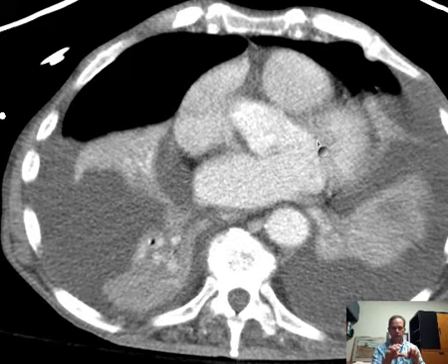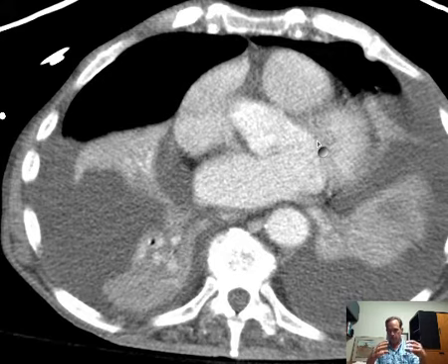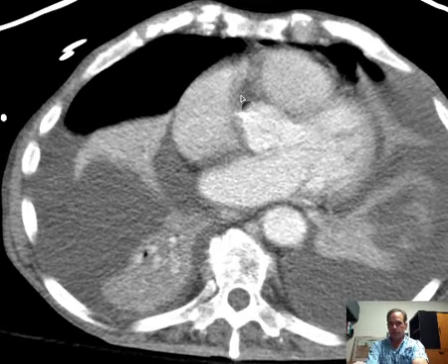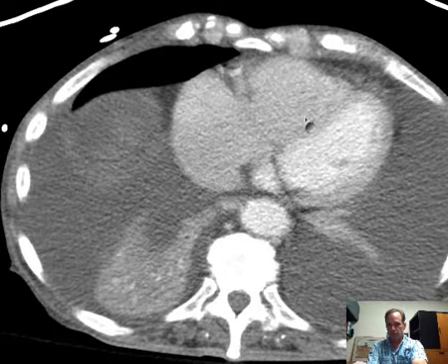So instead of what you might expect, which would be blood comes into the left ventricle, the ventricle contracts and goes out the aorta, the blood comes from the left atrium into the left ventricle, and then when the left ventricle contracts, it shoots it back almost the same way that it came from. So that is the aorta, and if you back up, you'll see it's coming from the left ventricle.